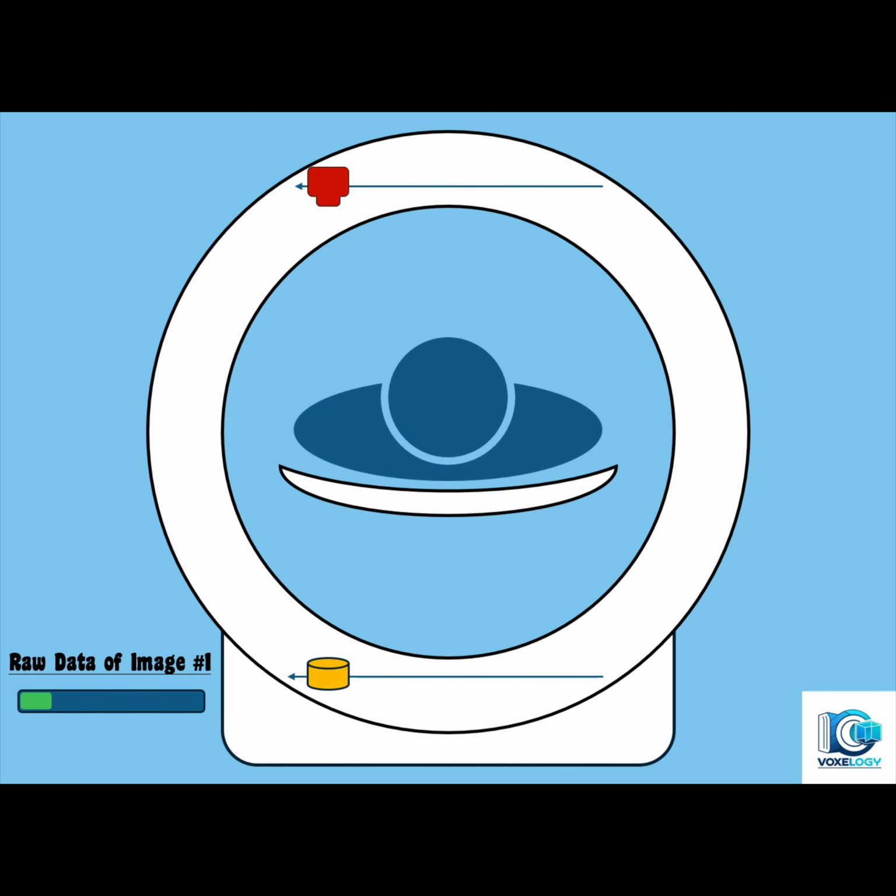After that, the source and detector returned to their original positions, and then both rotated the same amount around the central axis of the gantry around the patient's body, and the previous steps were repeated again. Each time, after imaging the entire width of the body, the source and detector rotated the same amount around the central axis of the device and imaged the patient's body from a different angle.